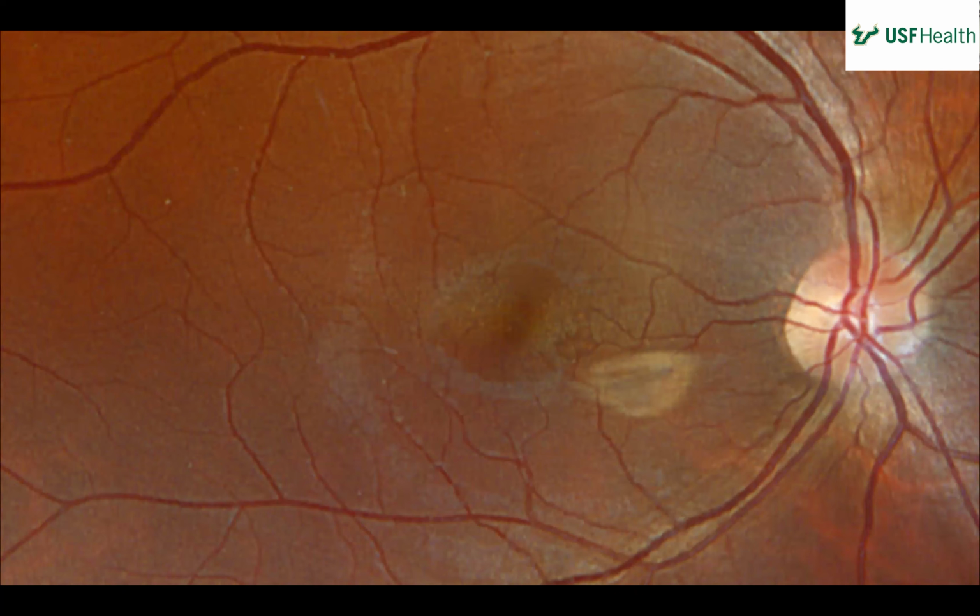And as you go through that, it's like your brain's doing a Rolodex and you'll come up with a couple of answers and you won't fail your boards. Size, color, borders, depth, elevation, and the company it keeps. Is it near the nerves? Is it near vessels? Are there other lesions like it around it? And that's how you describe a lesion. You go through that and you can't get any of that wrong. You can just get your diagnosis wrong, but you're more likely to come up with a better differential if you just take your time and go through it, I think.